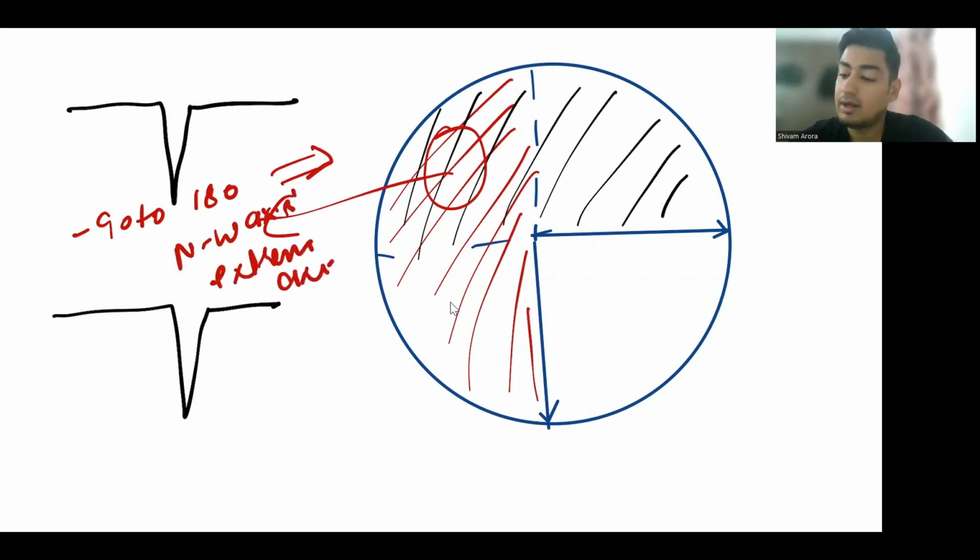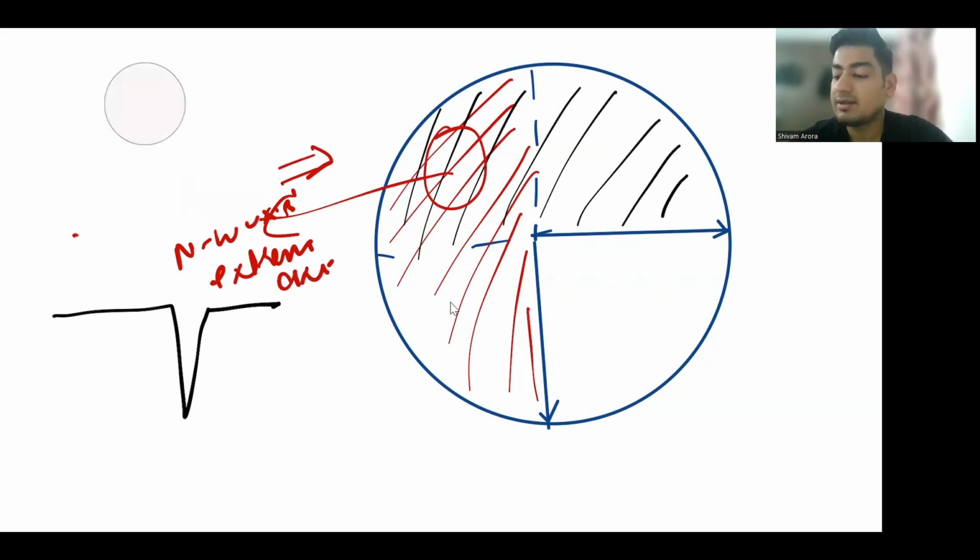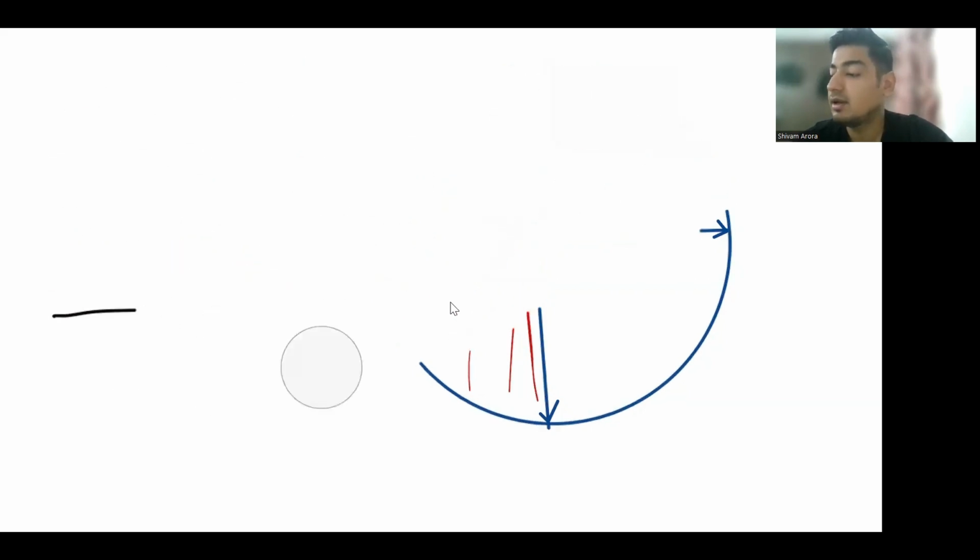Now we will take the last scenario. In this scenario, we have to look at lead 1 and AVF as well as lead 2.